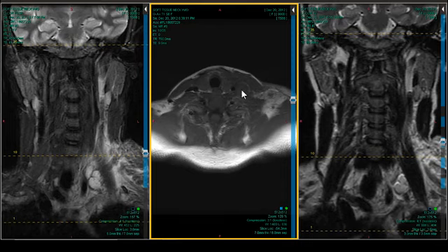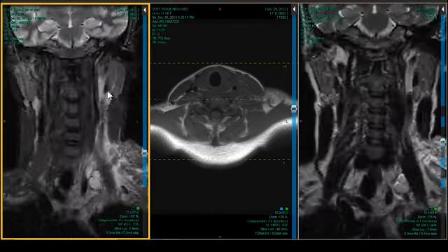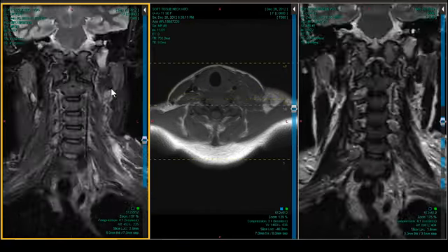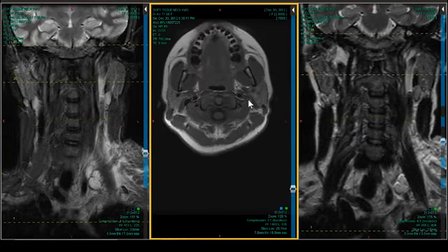There's the subclavian vein. There's the carotid artery. There's the carotid artery on the right. There's the subclavian vein on the left. Not only is it gray, it's big. I said it looked like most of the jugular was intact. It is up high. Let's see, is it up high? No, actually not. I take it back.